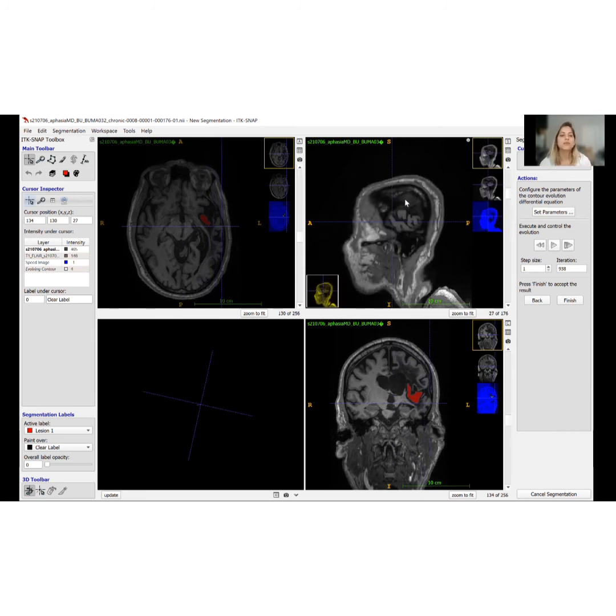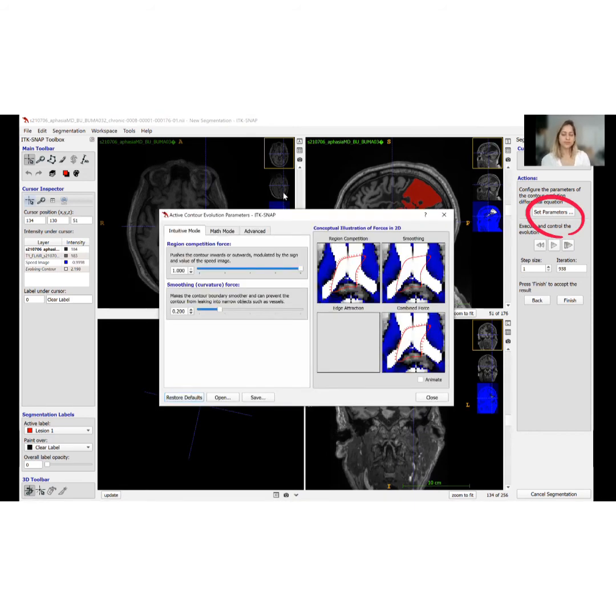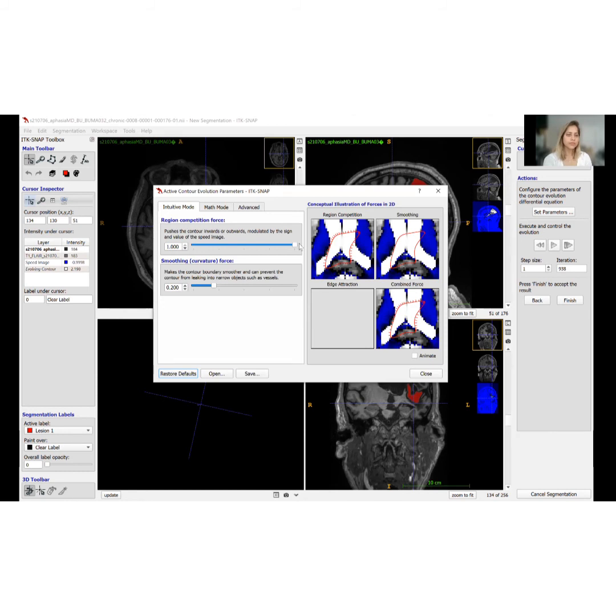Yes. So the parameters that Tamar was mentioning are right here. If we find that we're having some issues with how the bubbles are spreading, we can go in here and adjust some of these things. This first one is just the force, so how strongly it's pushing to expand. In our case, if anything, it was expanding very slowly, so we probably wouldn't want to mess with that.